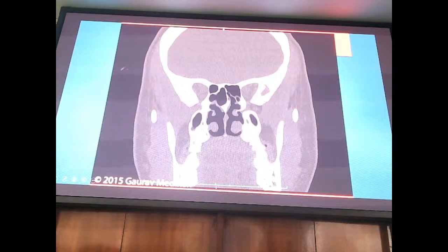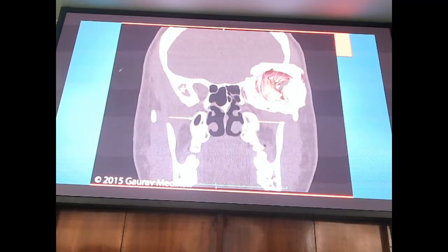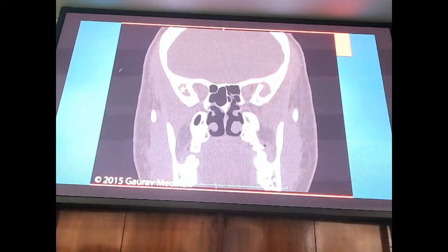Okay, because I have been asked to keep this very basic, I'm not going to go into too much detail about the superior orbital fissure and what structures pass through it, because that is more important for skull-base surgery than for routine FESS.